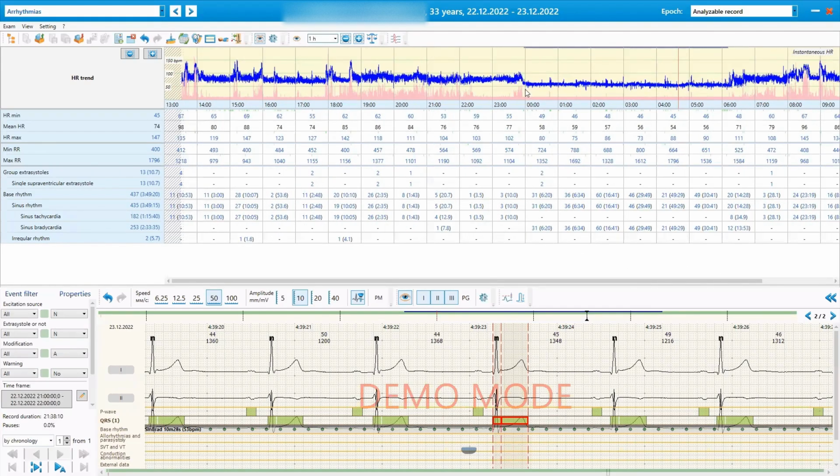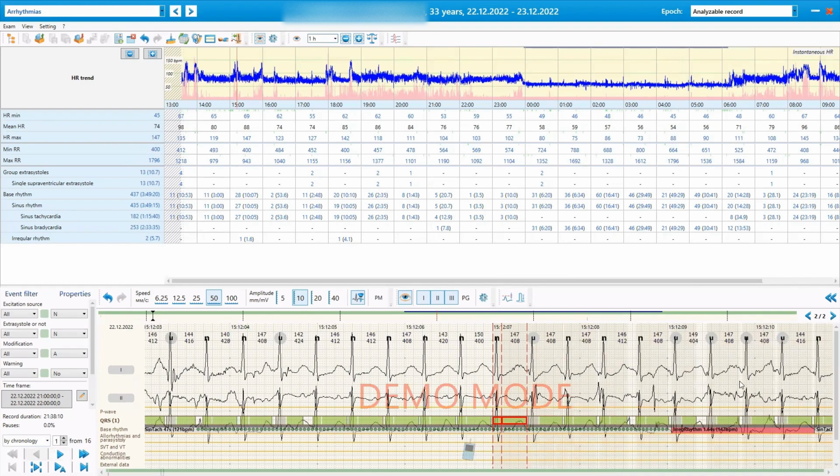events, for example, heart rate minimum, heart rate maximum during all the recording, or heart rate maximum for this hour. Flexible tool. Okay, you cannot see a mean heart rate event because mean heart rate is calculated and there is actually no such event here. Minimum RR and maximum RR interval. They may not be at the same time as maximum and minimum heart rate, because heart rate is calculated as an average and these are instantaneous data.